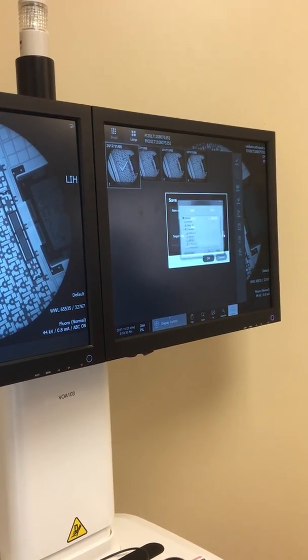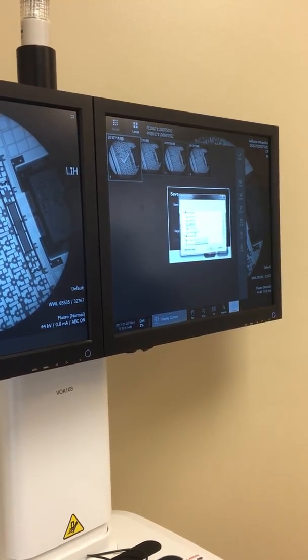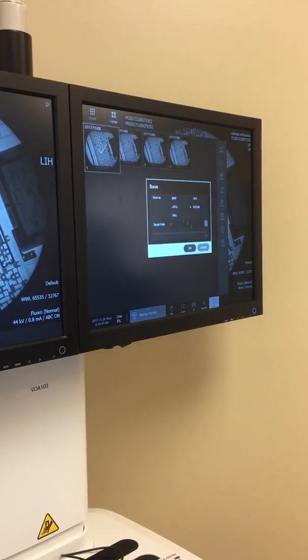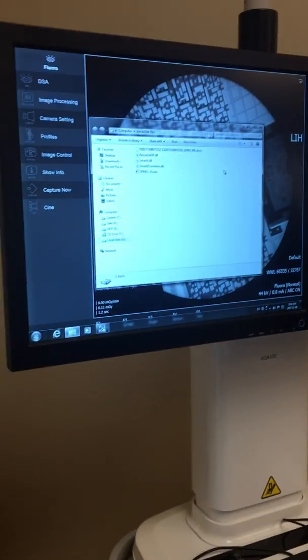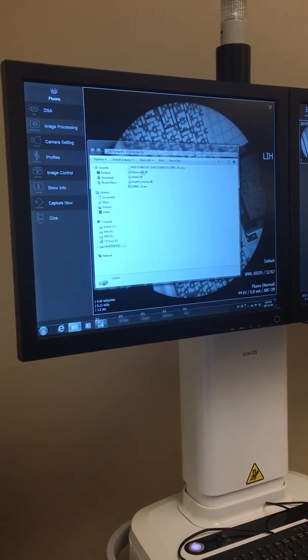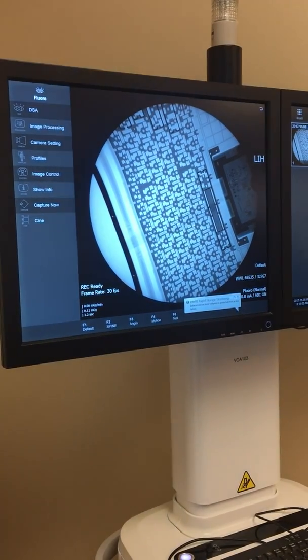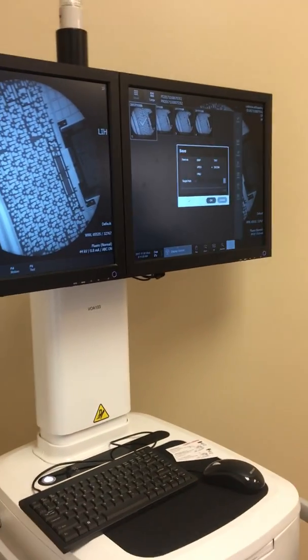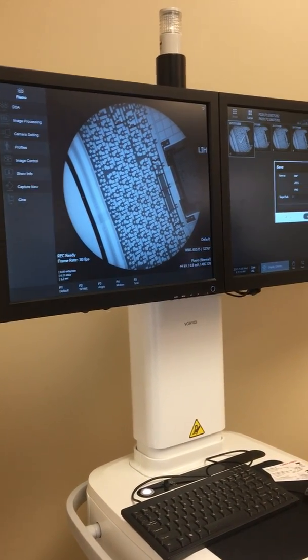Okay, it's kind of intuitive, just like Windows would work. You go through, you pick your flash drive, and we'd hit OK, and then we'd hit OK, and so this is my flash drive I have in the system. And this is our image. These are some other files I had on there. So it's that simple. If you do have a patient that needs something, you can throw a thumb drive or flash drive in there, and you can just throw the image on it. Very, very easy to do.